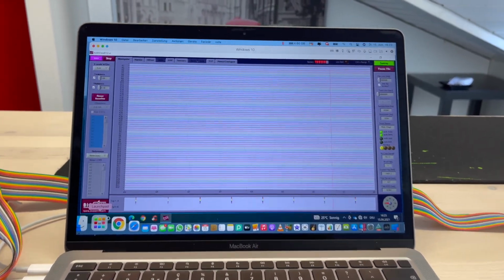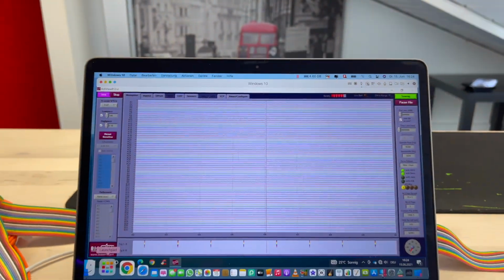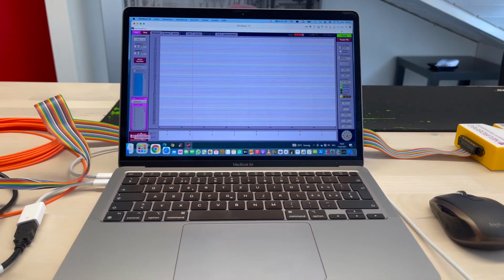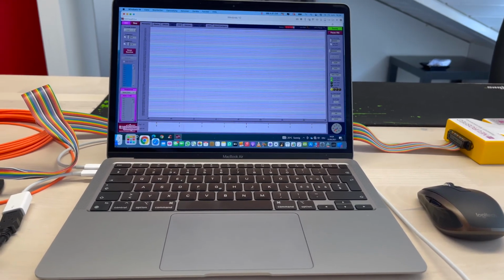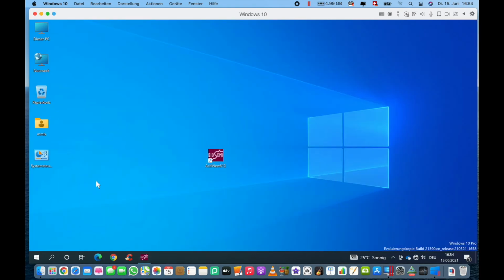It's coming through. We still have 4.6 gigabytes of RAM left over to run. So this thing is currently running on about 12 gigabytes of use. But that's fine. I think for that application, we can say it's all being nicely supported. We have now recorded 2,200 seconds, which is about 40 minutes, give and take. And it looks like it's saving the file beautifully down to our disk.